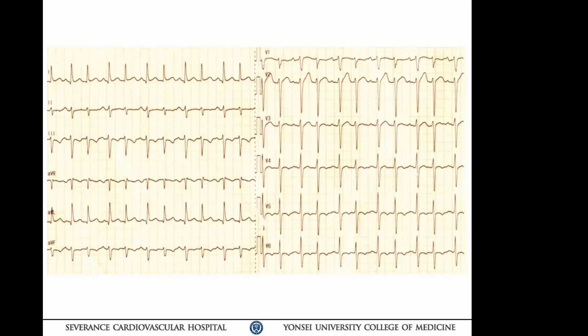If this is a junctional rhythm, I assume an isorhythmic junctional rhythm, you expect the premature beat coupling to be the same, but it doesn't. It's varied. Secondly, the premature appearing complex is narrowish looking, and then you conducted the P wave and QRS complex. So that favors what? It's not just a junctional rhythm. It has to be the lower conduction system maybe? That baseline sinus has what? Anterior fascicular block? You agree?